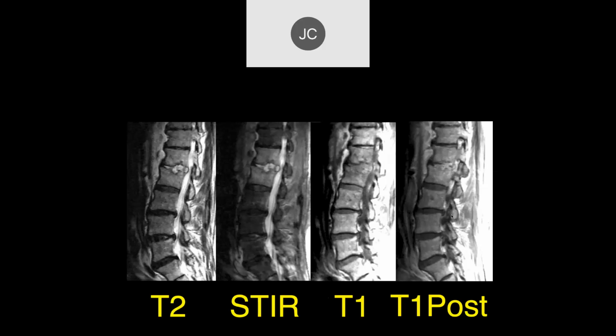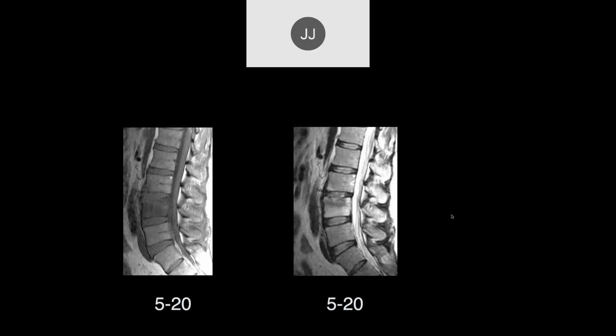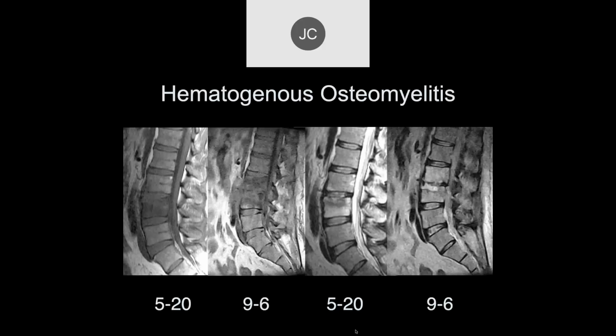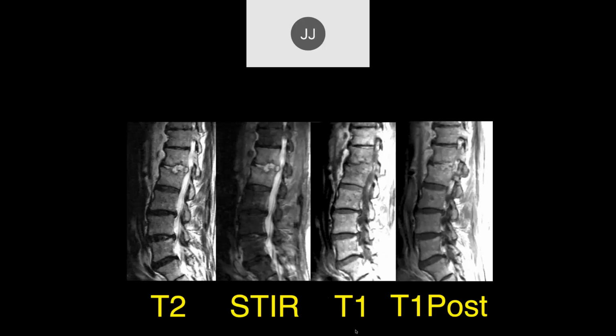Was he treated between the first and second imaging? I think so, John, but I don't remember the details. But I'm sure the diagnosis was made here. So I'm pretty sure the patient was treated, but I don't remember the details of the case. I would hope so. I would too. We consider this a semi-emergency.